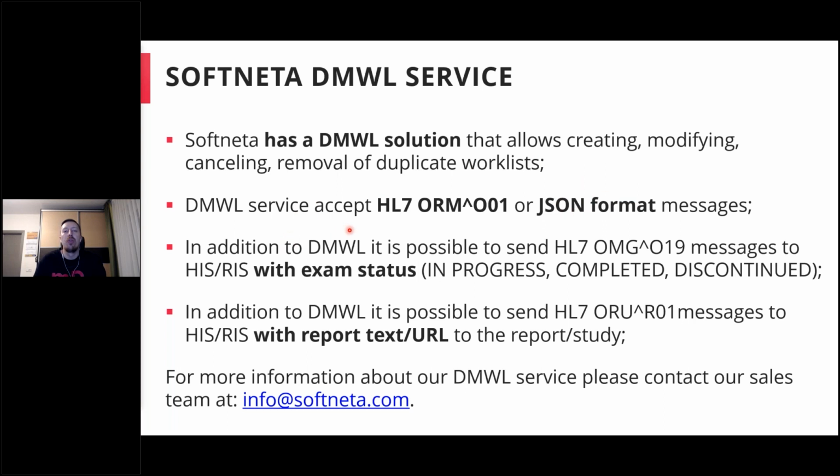And in addition to our modality worklist solution, it is possible to have a solution which would also send OMG messages, notification messages, to the HIS system with the exam status. For example, when the exam has started for the worklist, you would receive the in progress message. Once the exam is finished, you would receive the completed message, or if the exam is discontinued or canceled, you would receive the discontinued message.